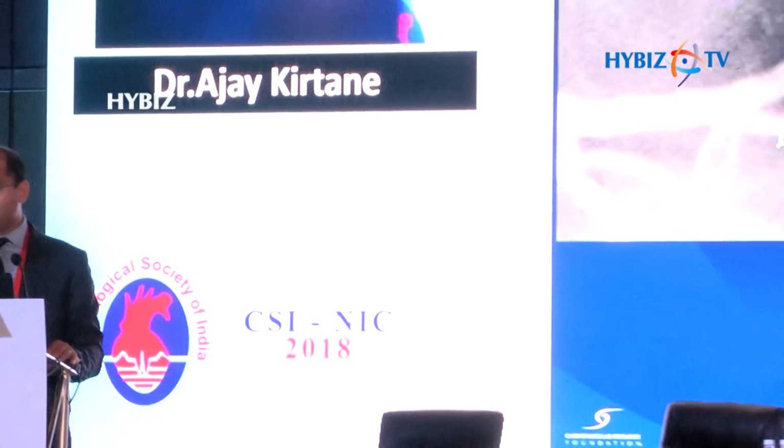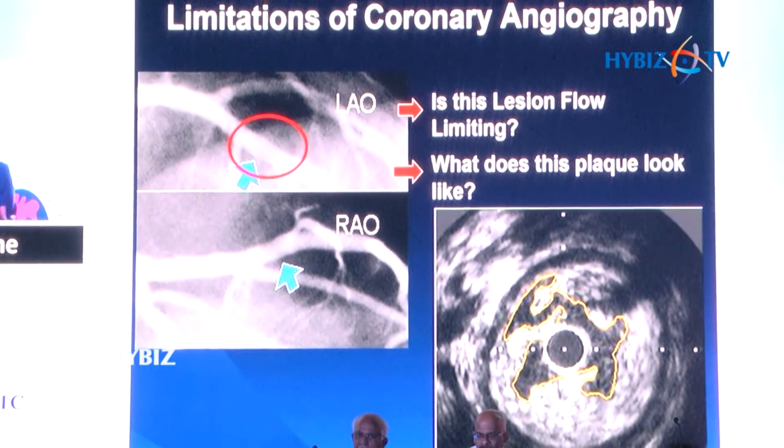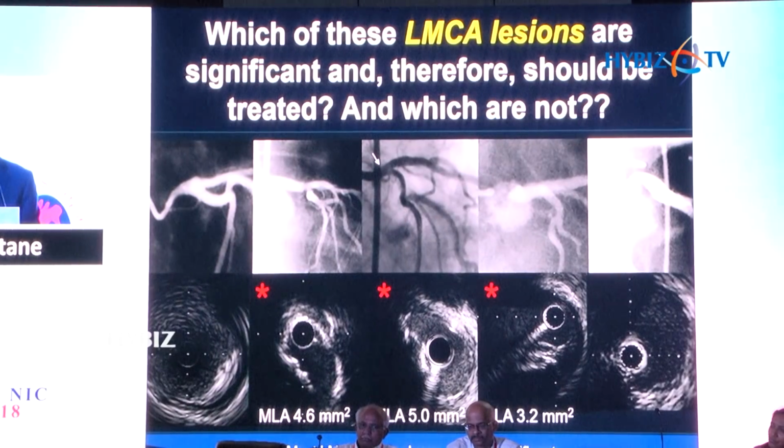Now, other things, just really briefly, limitations of the angiogram and why you might need to do physiology in certain cases, is this type of case here, where it doesn't look like there's any lesion at all, although it is a little hazy. In this particular case, this is what the IVUS showed. The reason that the vessel was hazy was because you would see this plaque in between, but the lumen area across any of these dimensions looks preserved. So sometimes in the acute coronary syndrome setting in particular, you might be misled by just looking at the angiogram alone, and that's why there's increased and renewed interest in imaging for these types of cases.